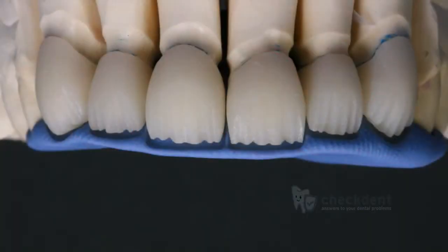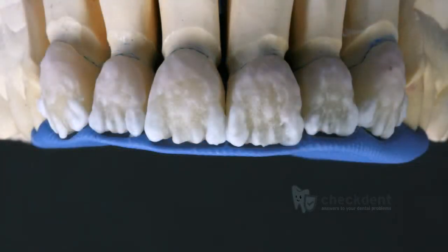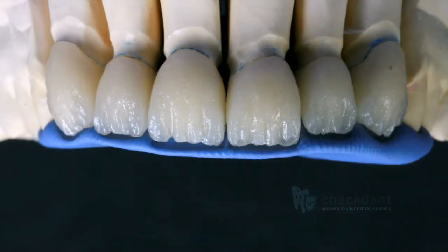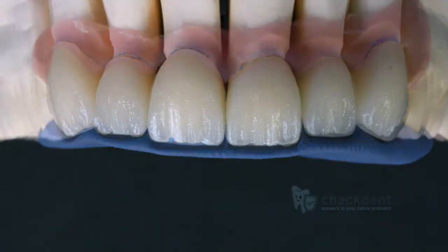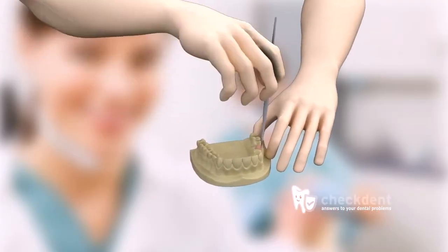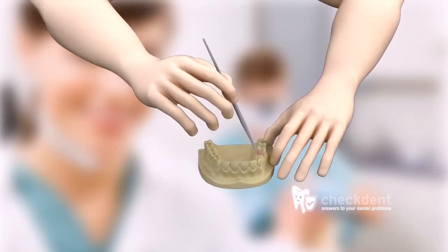In the first picture, the ceramic has been coated, which means that the patient sat by the dental technician, who laboriously painted onto the ceramic layer after layer until it matched the original teeth. The translucent effect of the tooth can thus be recreated. Not every technician can master this technique. Recreating a beautiful crown is an art.